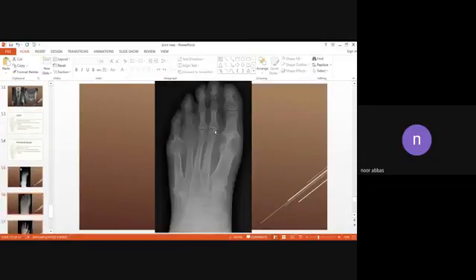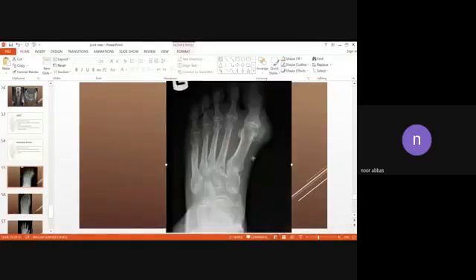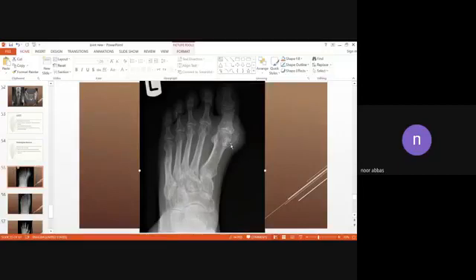This is an example of gouty arthritis involving the foot. You notice that there is relatively preserved joint space, and you have this punched out, beaten and eaten, bite-like appearance, a missing portion of bone that is typically somewhat away from the joint space. This is also an example of gout, and you notice the relative preservation of the joint space, this erosion happening at a distance from the joint line, and the formation of a soft tissue nodule that is characteristic of tophus.